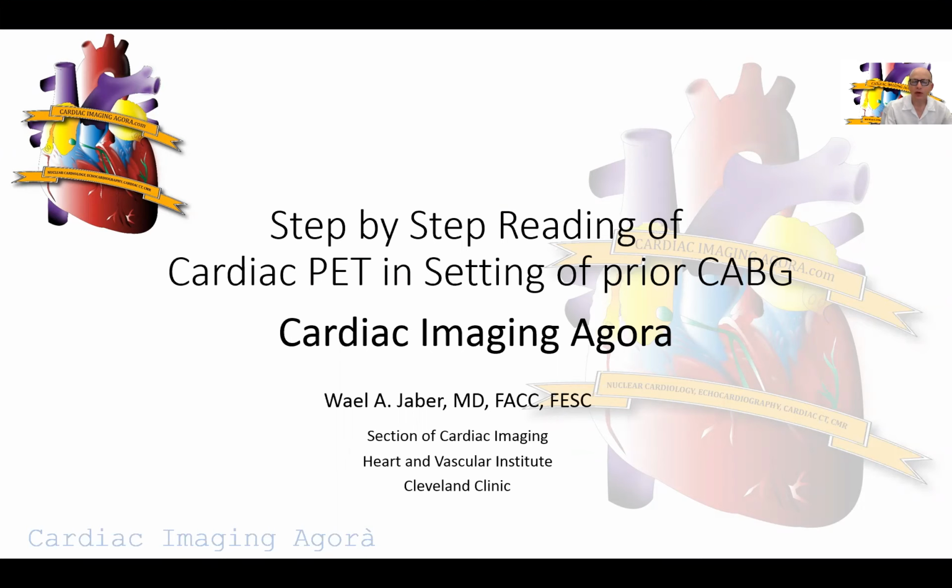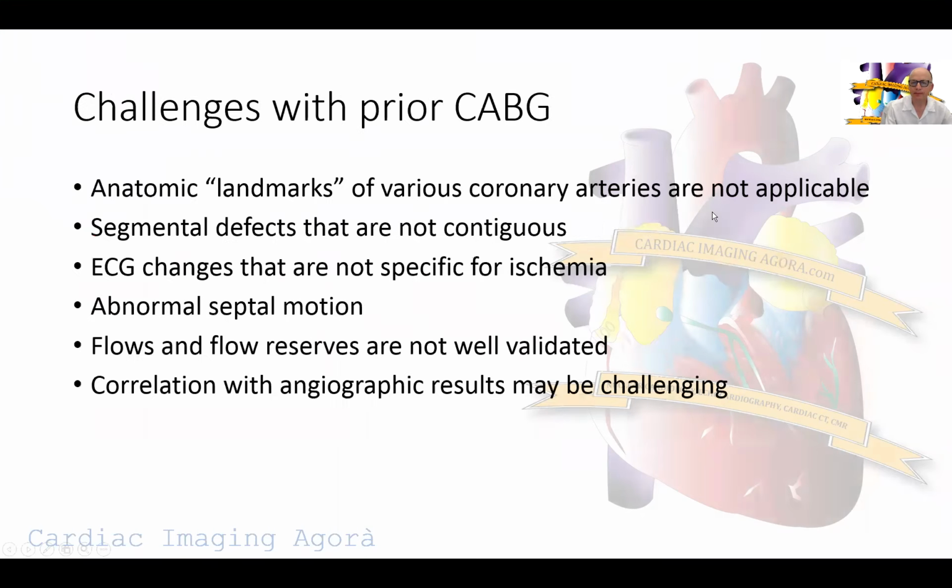In this session, we will have a discussion on how to read a cardiac PET in the setting of prior CABG. Patients with prior revascularization, especially surgical revascularization, pose some challenges for the traditional reading of a SPECT.